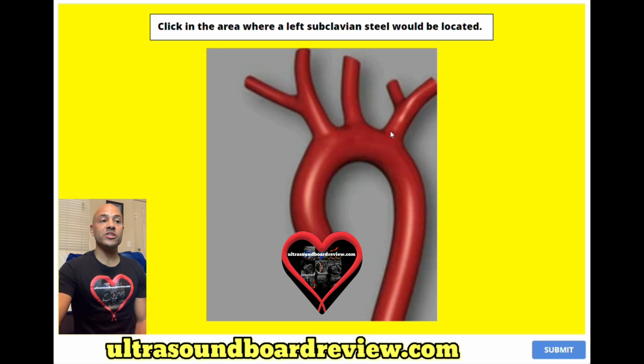The answer is right in this region here. This is the proximal subclavian artery, so I'll just place my little marker right there. This is the vertebral artery in which you'll have retrograde flow coming down into the subclavian artery, helping perfuse the left arm.